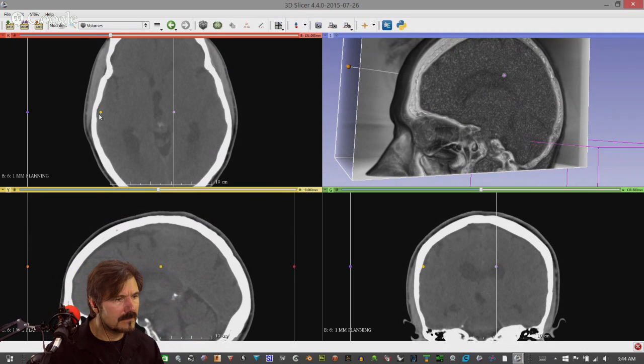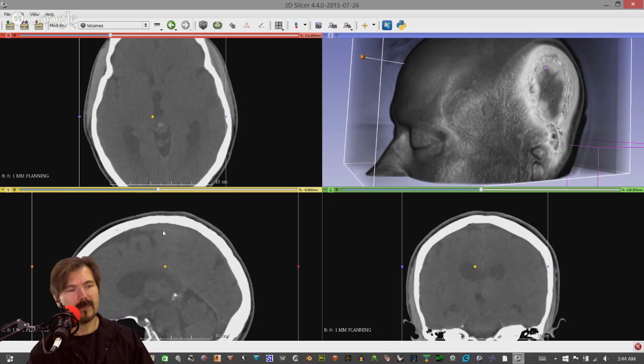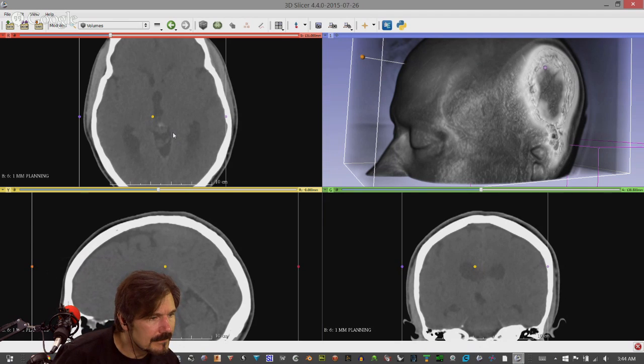essentially posterior to that purple dot you have. So if you move the purple dot a little bit down, oh, okay, that's fine. So exactly where your mouse was, if you go back up and move, and basically your mouse, which quadrant do you want me in, the red box? And I would say right there, kind of where you have your mouse, a little bit up from that, you're going to see that is going to be where you're going to have a thalamic mass.